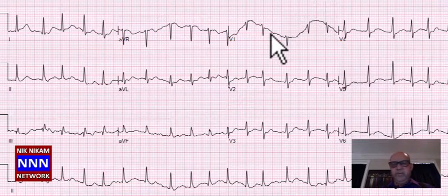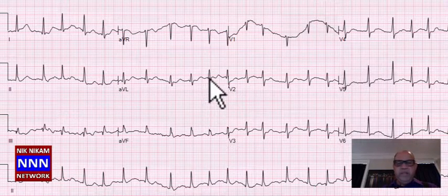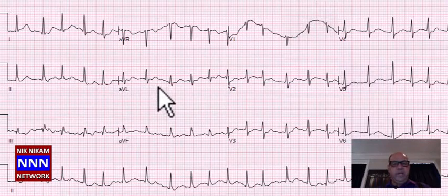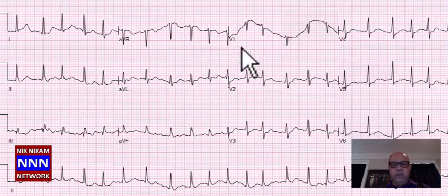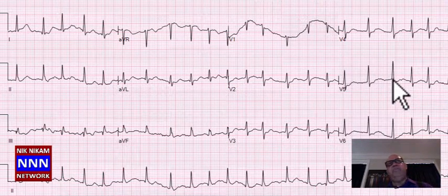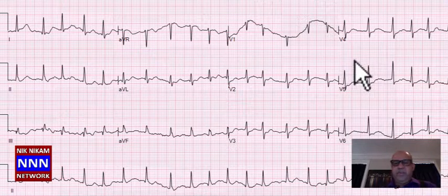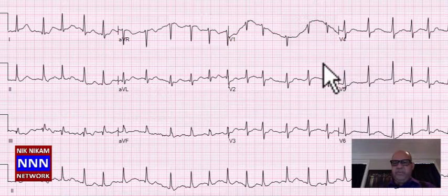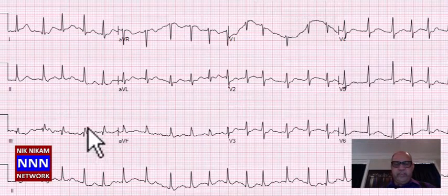Just means this left atrial enlargement, and perhaps that's one of the equivalent criteria, but we need to look at all the rest of them like we are looking at a normal electrocardiogram. So lead 1 and AVL looks okay, inferior leads look all right, anterior leads good R wave progression, lateral leads look okay. There are some non-specific STT changes, and STT changes are most commonly seen in patients with atrial fibrillation, especially with the rapid ventricular response, but nonetheless we are dealing with an abnormal electrocardiogram with atrial fibrillation, rapid ventricular response, and non-specific STT changes.